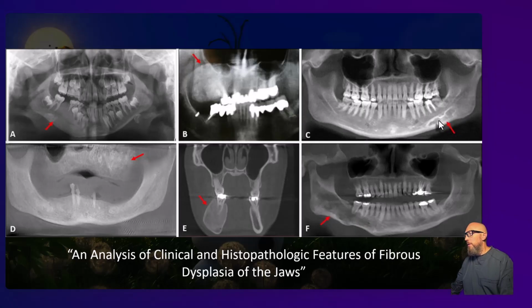Here's a rare one, but when it's originating below the canal, maybe think fibrous dysplasia. Most of the lesions we talk about are odontogenic. And so that rules out about 75% of the lesions that we talk about in this course. And so fibrous dysplasia is one that fits here. Doesn't quite look like a Stafne defect because it's more filled in with bone.